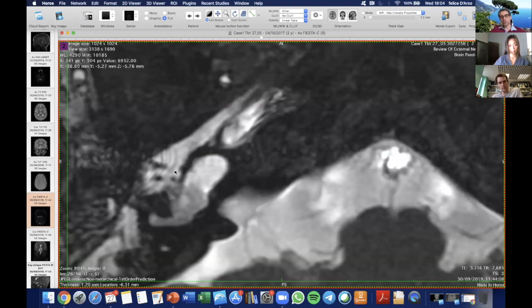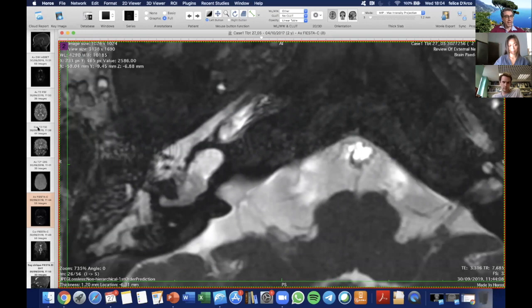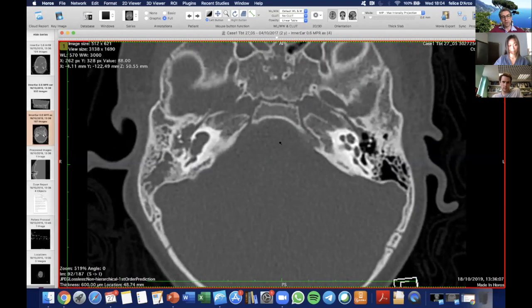So of course, when you have all these bones involved, you don't want to rely on the MR only, so we did CT. So first of all, I discussed with Robert, and then as always, when we have these complicated cases, we did a CT that confirmed the malformation.